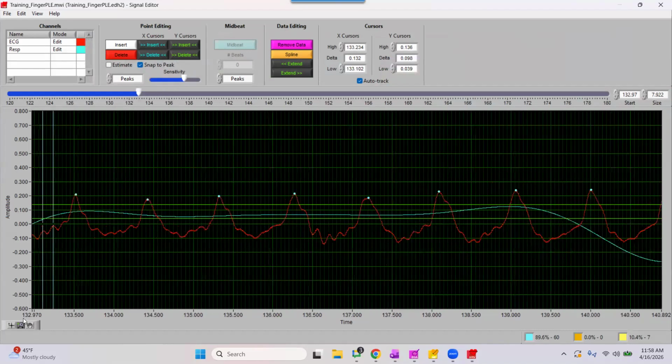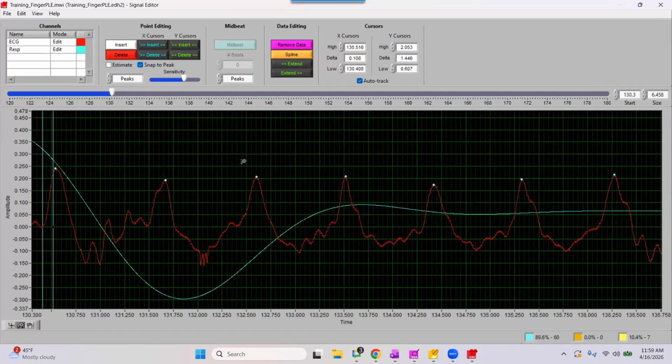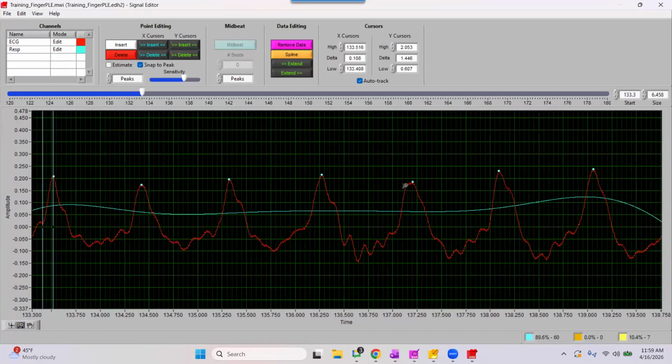So in comparison to the ear PPG data that we just saw, let me zoom in a bit further on my y-axis as well. When we zoom in further here, we do have definition in our systolic peaks in certain intervals, but in others, things become a bit trickier.